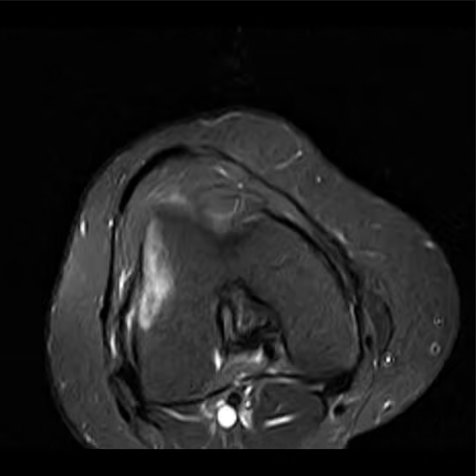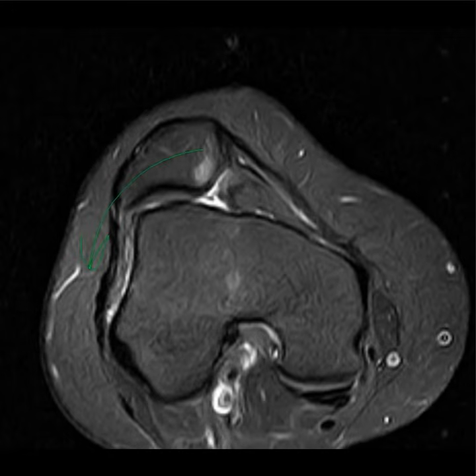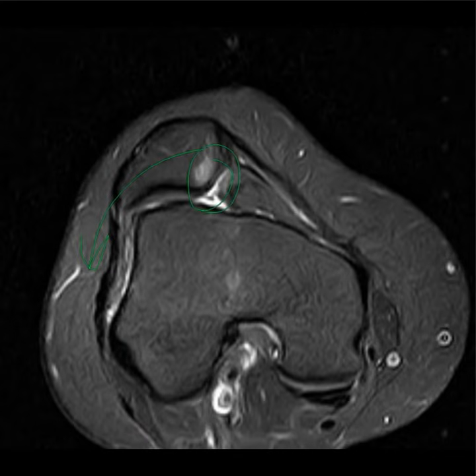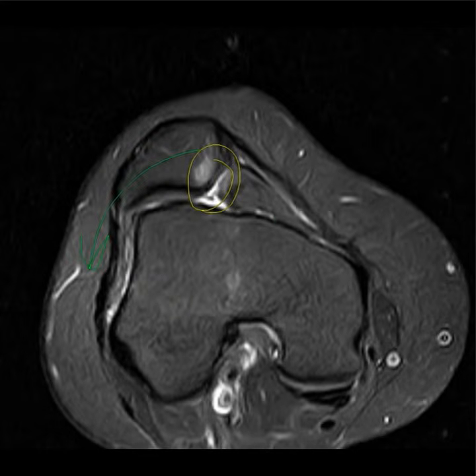Excellent. So overall, what does that mean? I think this is a case of lateral patellar dislocation, and since it was dislocated, this surface came into contact with this surface, and then the bone contusion happened, and of course there is some tear of the medial patellar retinaculum due to the dislocation.